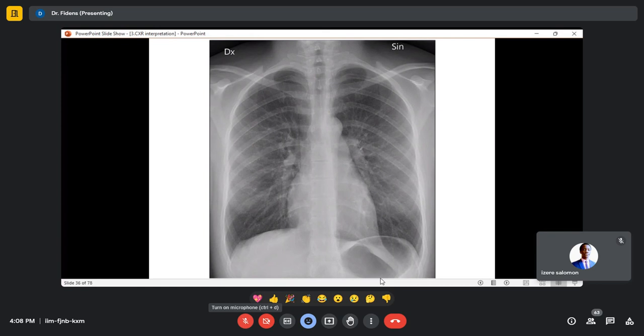It's the same as you. It's not for this special person. Posteriorly, the lung goes deeper. Okay. Lecturer, about those gastric air bubbles, are they normal? Because I see it's a big one. Yeah, but it's not the first time we see it. It's the second time, and I explained the reason.